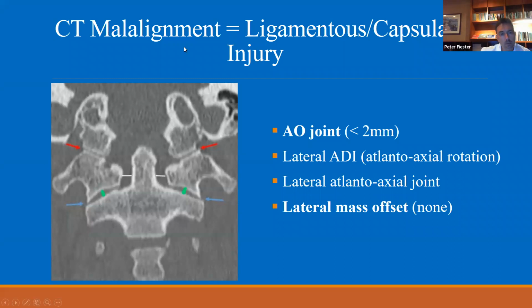Yeah, I can. There was one study that measured this relationship in normal individuals, and it can be really asymmetric. I don't remember the exact number. The asymmetry is okay as long as there's no lateral mass offset, the lateral mass hanging off here. If there's asymmetry and some overhang of the lateral mass of C1, in my mind, that makes me worry that there's some pathologic translation or pathologic rotation occurring. But it can be very asymmetric and does draw your attention. So it is a bit of a problem, and sometimes you have to do an MRI to tease it out.